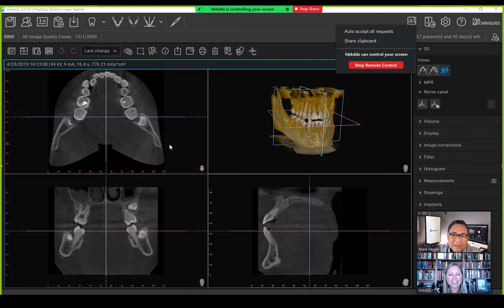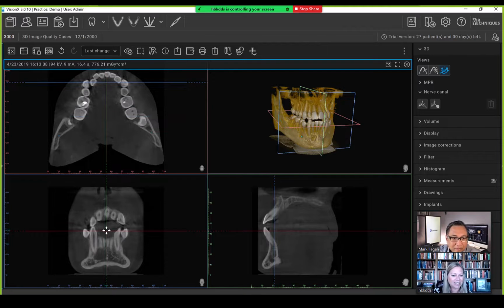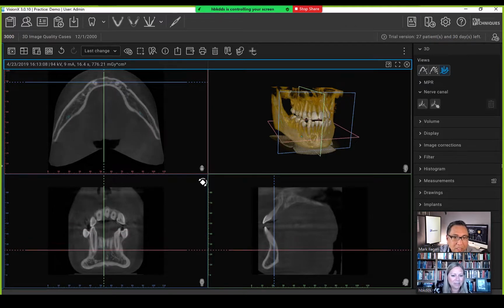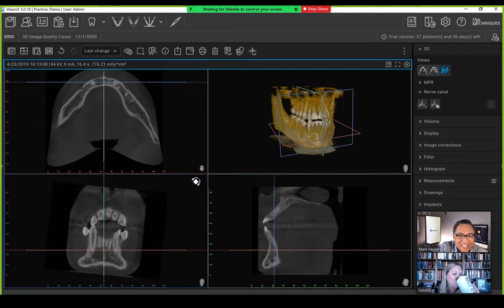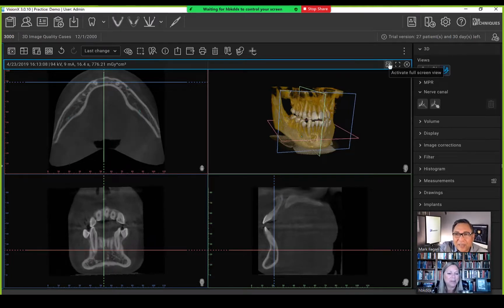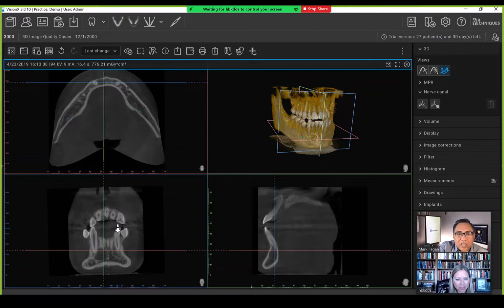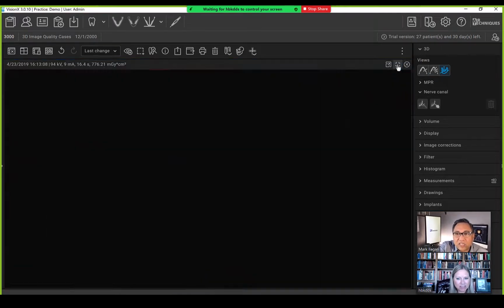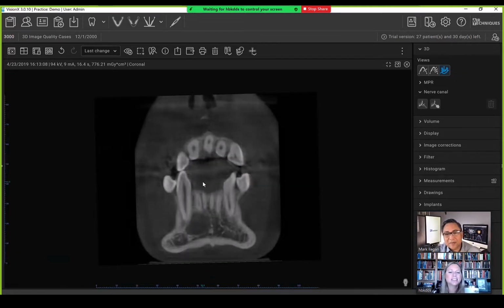So we come back down and look at this and make sure what it's doing with the teeth. Let me go ahead and pop this guy up in the corner. I just rotated that. I'm messing with the software altogether now. It's super easy software, though. This makes it extremely large. And when I click in here, I have this view to maximize it for each window, and that's where the little square went.